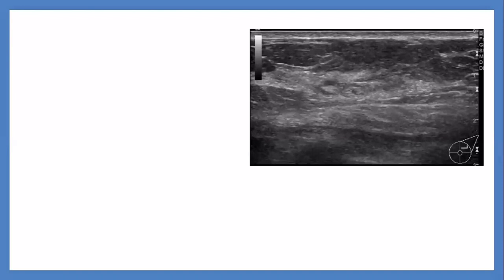Where have you seen it? I'm looking to see if I can point. I don't know how I can point. You can describe it: within the anterior breast, below the subcutaneous fat, within the middle, within the posterior part of the breast, within the glandular tissue, like that. Okay. Yes, just below the subcutaneous fat. No, go to the other side. Here? Go to the left, no, to the other side.